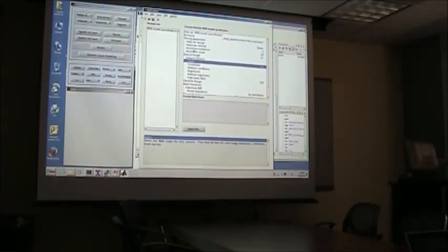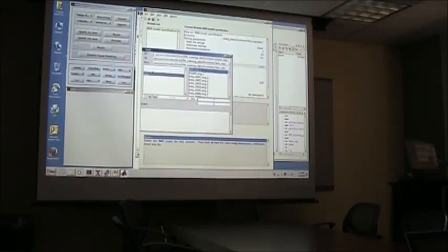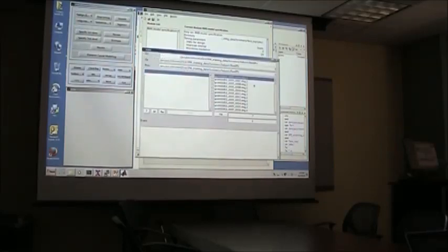So you set your directory, some basic information here, and most importantly, you want to select the scans that you use. From the directory where you did all your pre-processing, you're now going to select the last scans from the pre-processing steps.